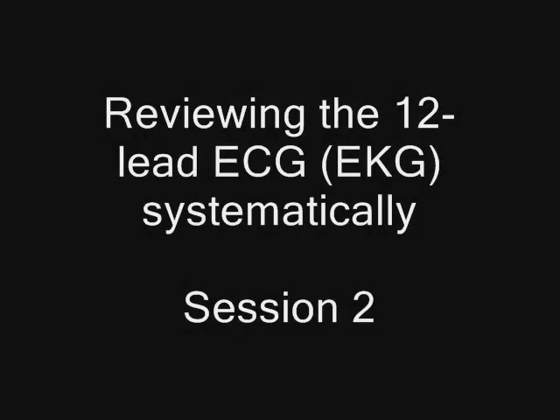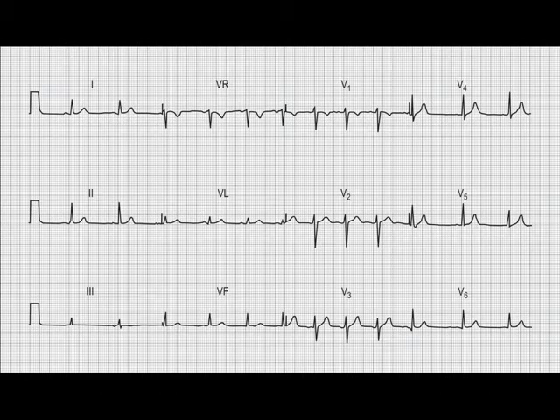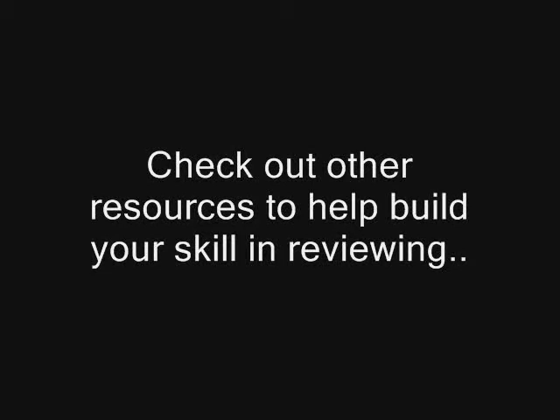Welcome to session 2, and in this session I'm going to teach you how to review systematically the 12-lead ECG or EKG. It's very important, however fast you become at this skill, that you do review systematically, so you don't just focus in on the more obvious abnormalities. There's a lot of resources out there now, books, online, colleagues and so forth, so do utilise these to keep practising the skill. It's very important.